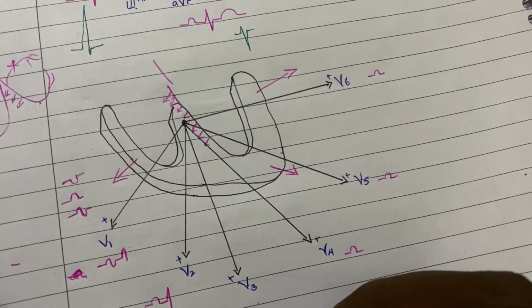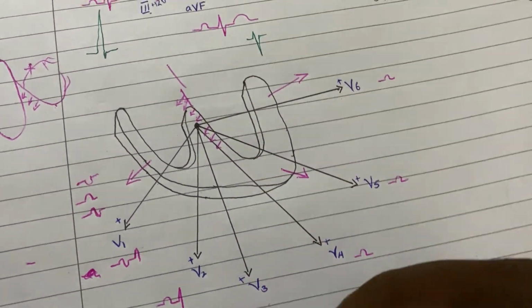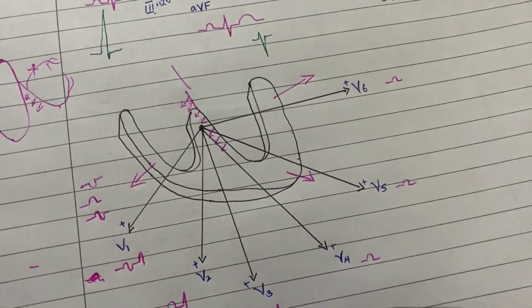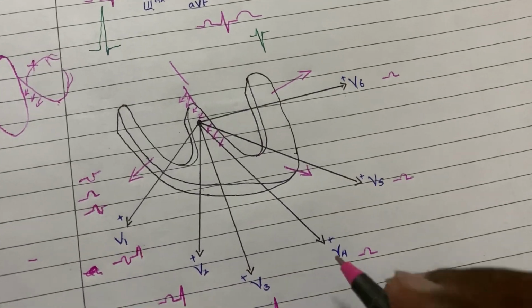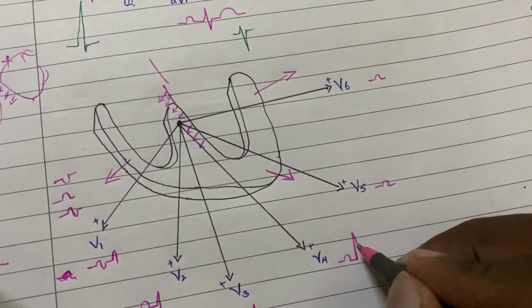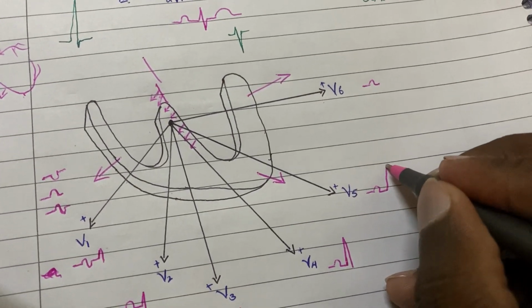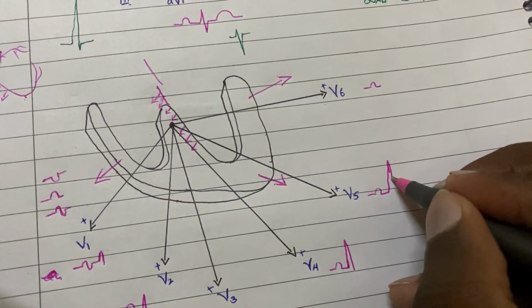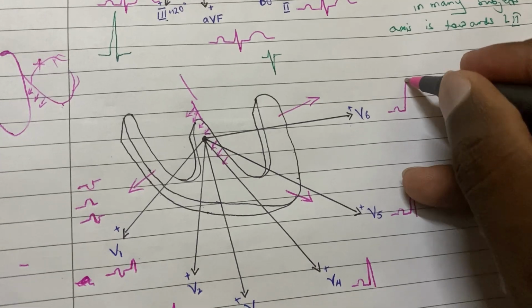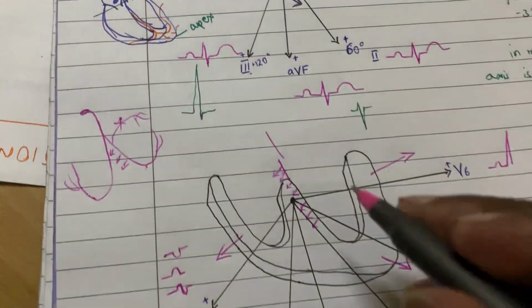See the myocardium it is passing; it will be a bit taller compared to this one, and then here even taller, and then even taller.